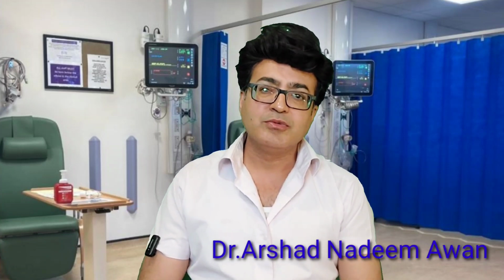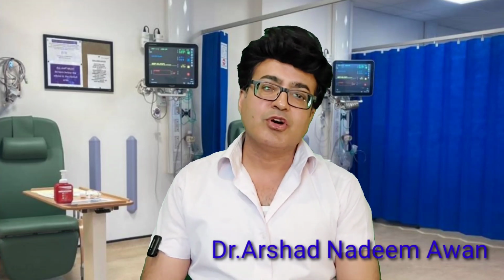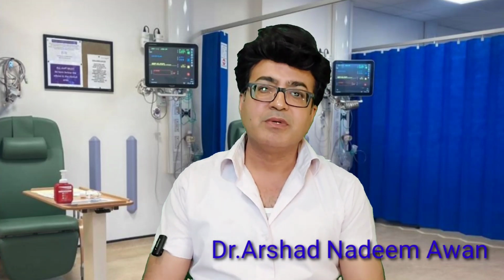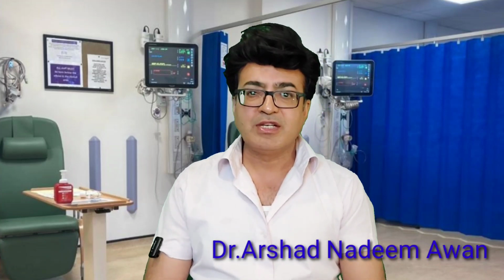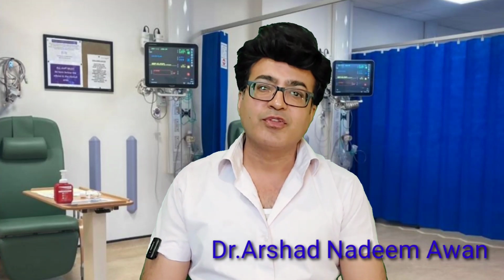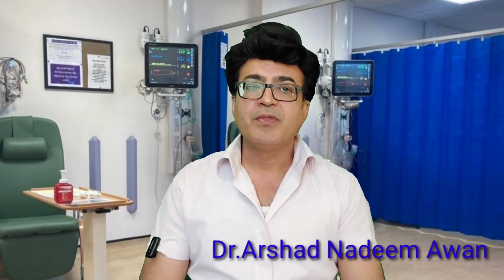Sometimes you may observe an abdominal aorta thrombus or a DVT thrombus. The thrombus features are the same whenever it happens anywhere in any of the vessels. So as far as the ovarian veins are concerned, it will be similar to other thrombi as well.